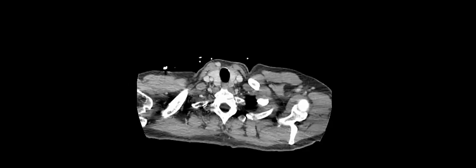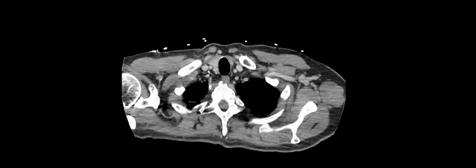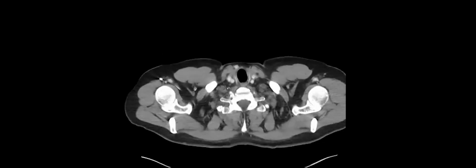So there's this person who had basal cell carcinoma around the nose area and underwent ICI therapy, immune checkpoint inhibitor therapy. And this is pre-therapy, and we are focusing on the thyroid. So the thyroid looks normal. A couple of months, I think 6 to 8 weeks after therapy, we see the change in thyroid. So it is immune checkpoint inhibitor induced thyroid atrophy. And the drug this patient was on was cemiplimab.